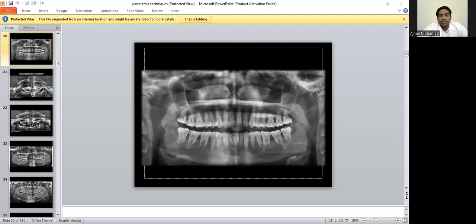Then comes the X-ray film and paper. It rotates around the patient in the same manner but on the opposite side. Now you can see the animation of how an OPG film is formed, conforming to the elliptical shape of the arch. See here, the red dot conforms to the rotation centers. This is our dental arch. The X-ray tube and the film on the opposite side rotate around the patient, conforming to the rotation center. The patient's dental arch is placed in the focal trough region.